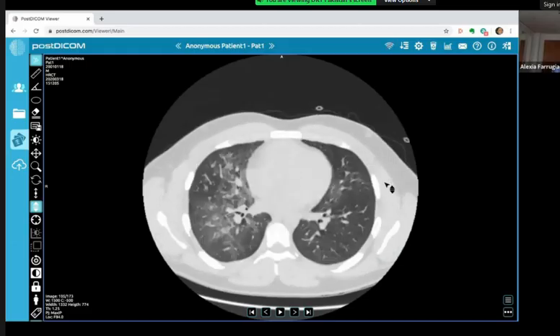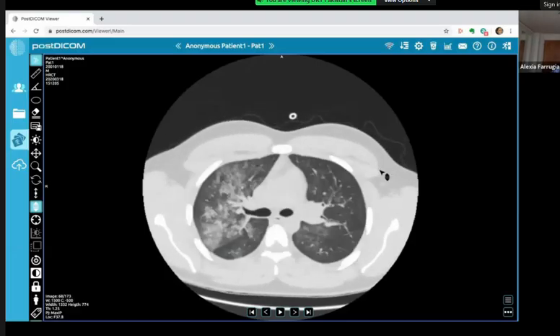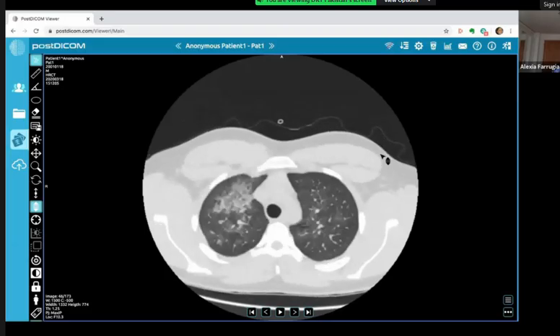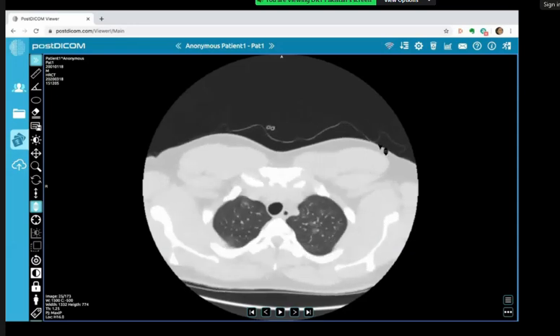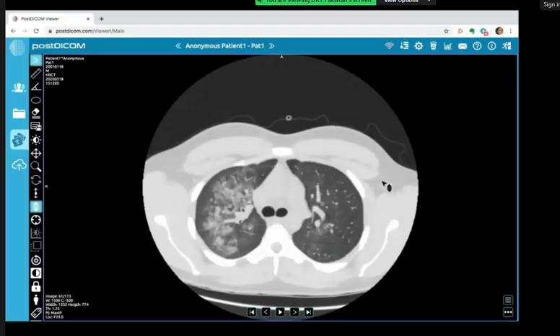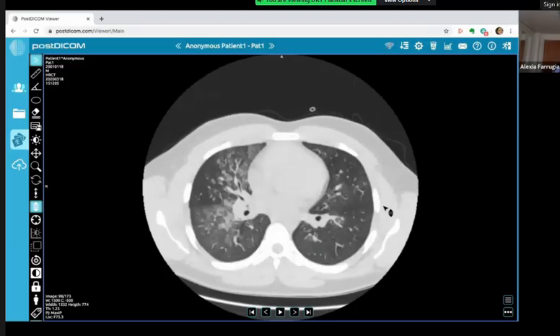Great. Okay. So this patient also had hemoptysis. Oh, in that case, this can be a pulmonary hemorrhage, alveolar hemorrhage, because of the diffuse ground glass area, which could be diffusely showing as opacification on the right side. Great, great.